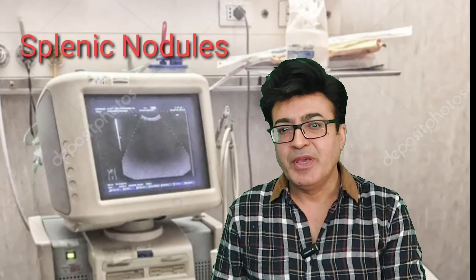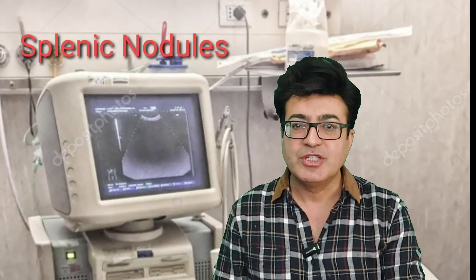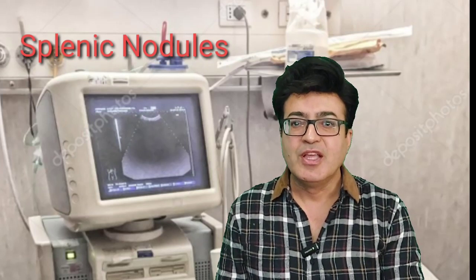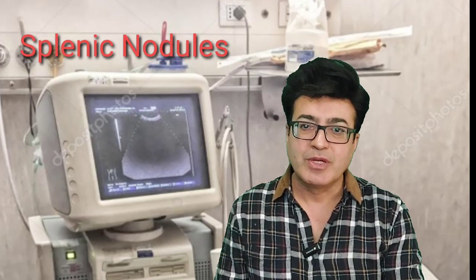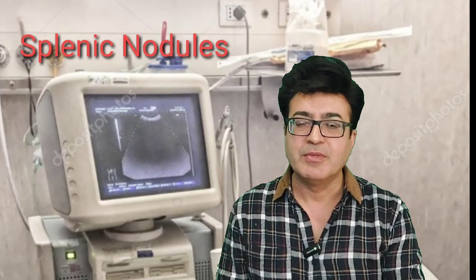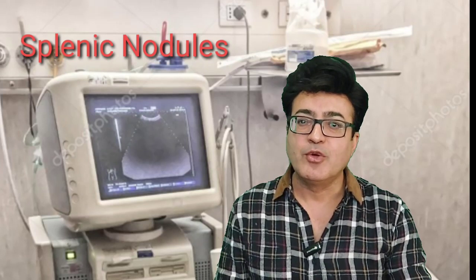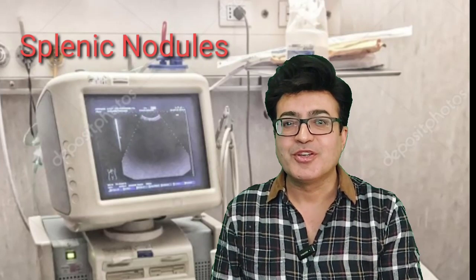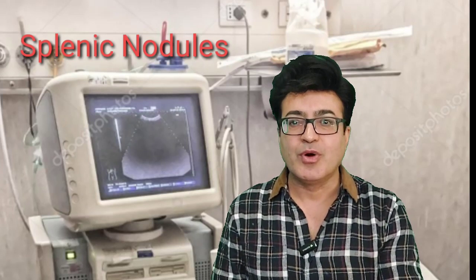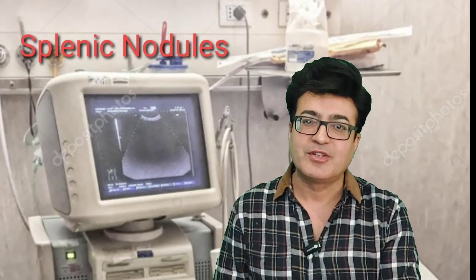Before writing the report, make sure that you are equipped with all the information. You should have the previous history of the patient and all other relevant information with you. If the patient is already diagnosed as tuberculous or lymphomatous or with any other malignancy, you should have all that information. In the report, you must mention where the spleen is located. Sometimes, because of situs problems, the spleen may be in the right quadrant, so you have to mention that the splenic location is within the left quadrant.